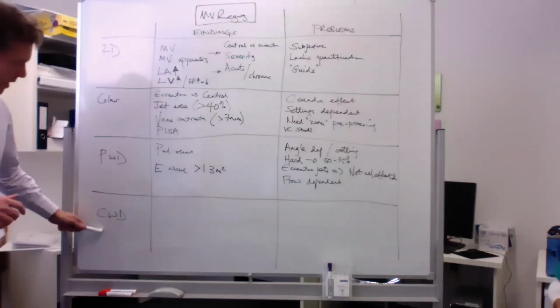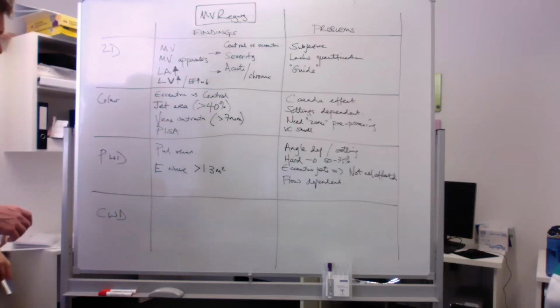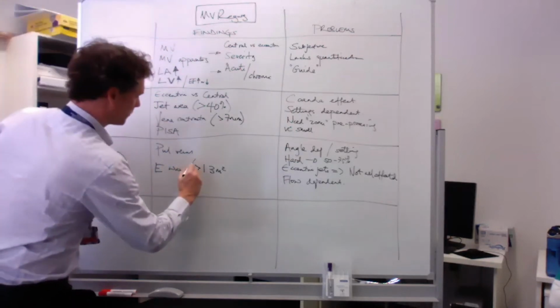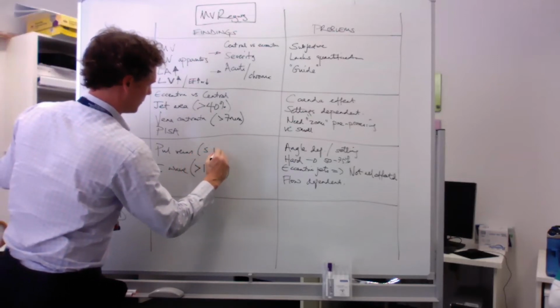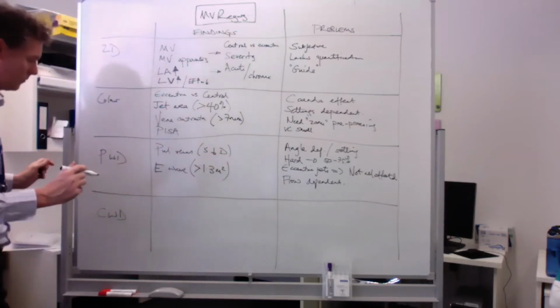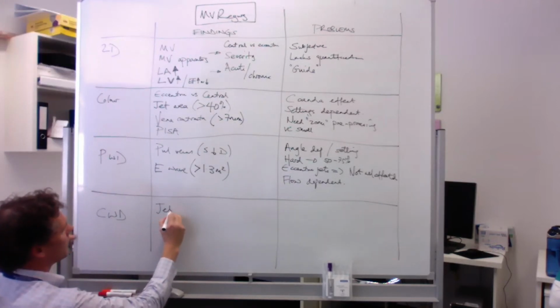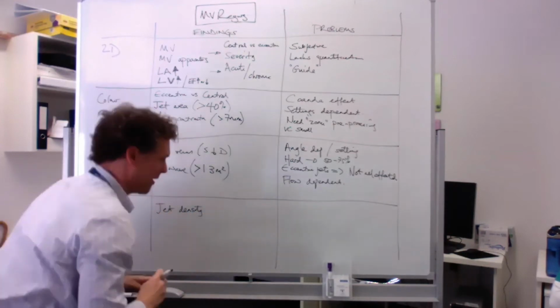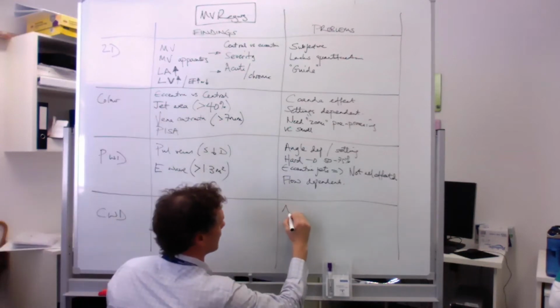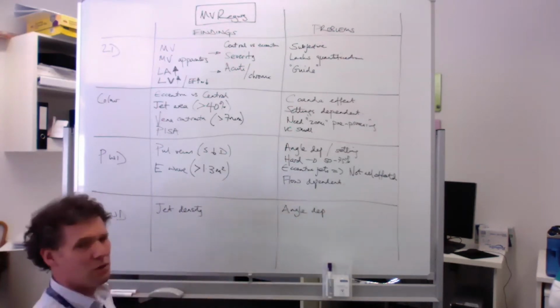Sid, help us. Finally, let's talk about continuous wave Doppler to assess mitral regurg. Qualitatively, the density of the jet, which you see on the continuous wave Doppler, can determine the severity of MR. Yeah, nice, the jet density. And what's the problem with that? Probably it depends on the settings which we have, angle. The continuous wave Doppler?